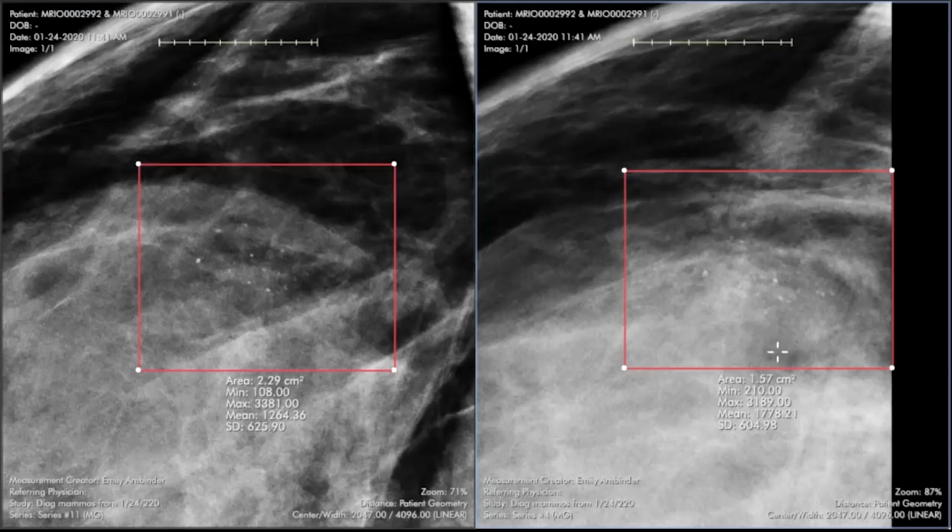These were excised, and there was no malignancy on the surgical biopsy, and the atypia was completely removed. So this is when we're doing the 6-month follow-up. This is an example of a change that would cause us to change our recommendation from a BI-RADS 3 to a BI-RADS 4, because amorphous grouped calcifications no longer fit into that BI-RADS 3 category. And so the radiologist appropriately recommended biopsy, and we were able to diagnose this atypia.